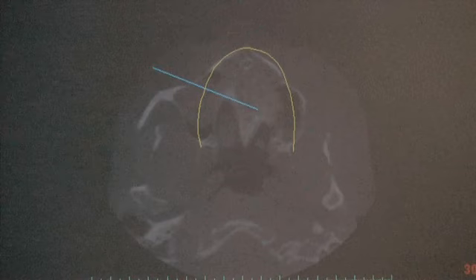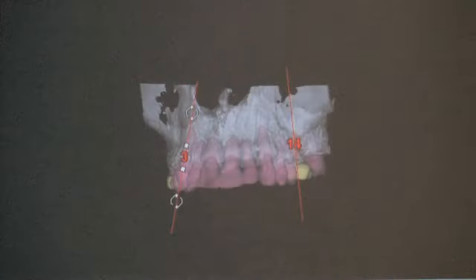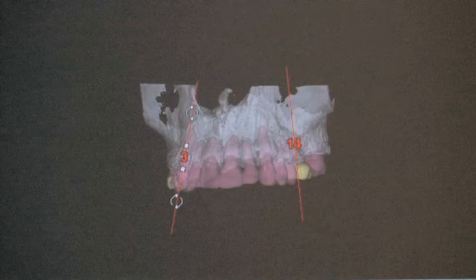And my intent is to always try to put the longest, fattest implant we can in any individual situation, obviously being very aware of the prosthetic limitations. Our crown and root ratio has to be positive enough so that we don't overstress the area.